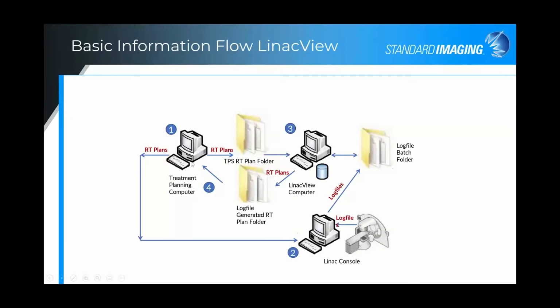So here is the basic information flow for LinacView. Everything begins right here at workstation number 1, the treatment planning system. And so, of course, there your plan is generated, and one needs to export both, of course, through the Linac as well as to a particular folder that is monitored by LinacView.